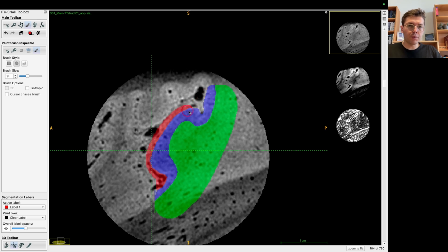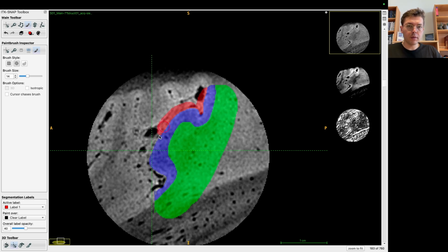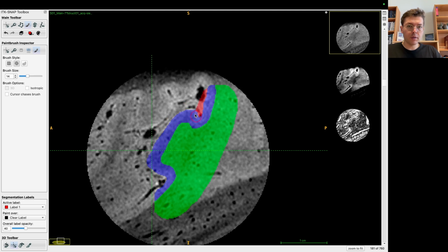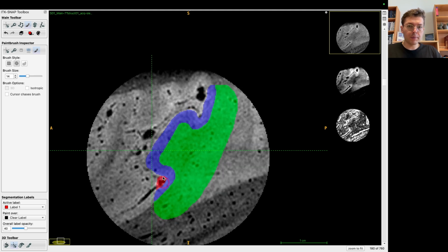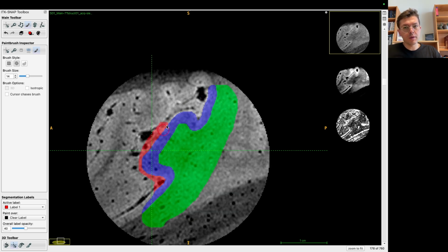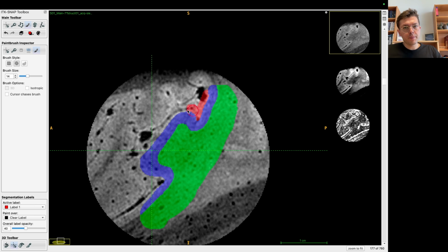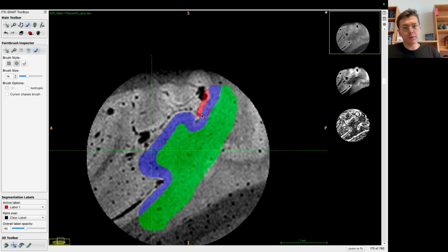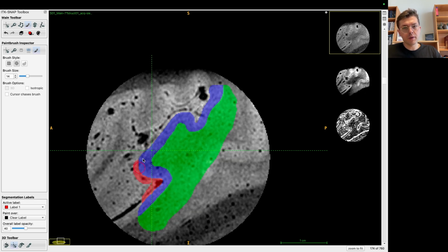Again, you don't need to be so precise here. This is not the final precision stage, but a step that leads towards there. And hopefully you are seeing that we are getting there step by step. Maybe once we proceed a bit with this, there will be other ways to speed up the process. I don't know now. I cannot think of it right now.